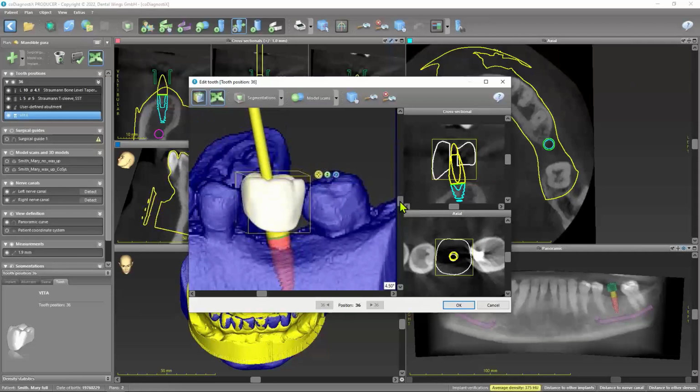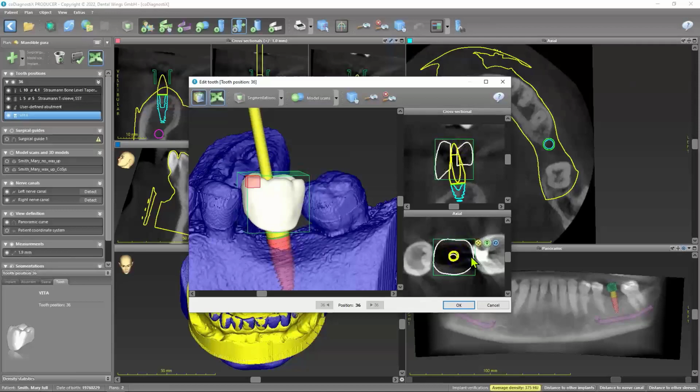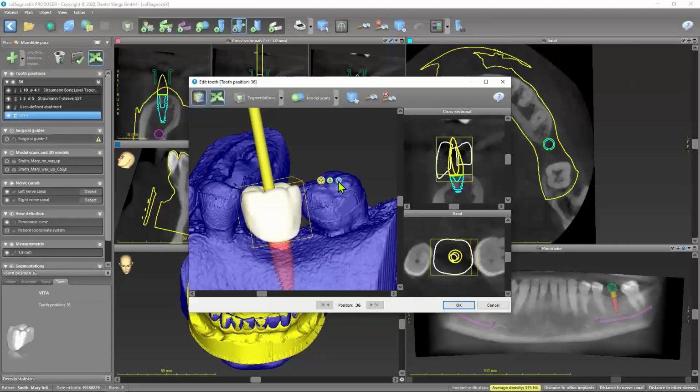the 2D picture. The green button is changing the size of the teeth. Make it smaller, maybe a little bit here. And the blue button is for the angulation. So this is just for easy. You cannot export this. This is important. So it's just for orientation.